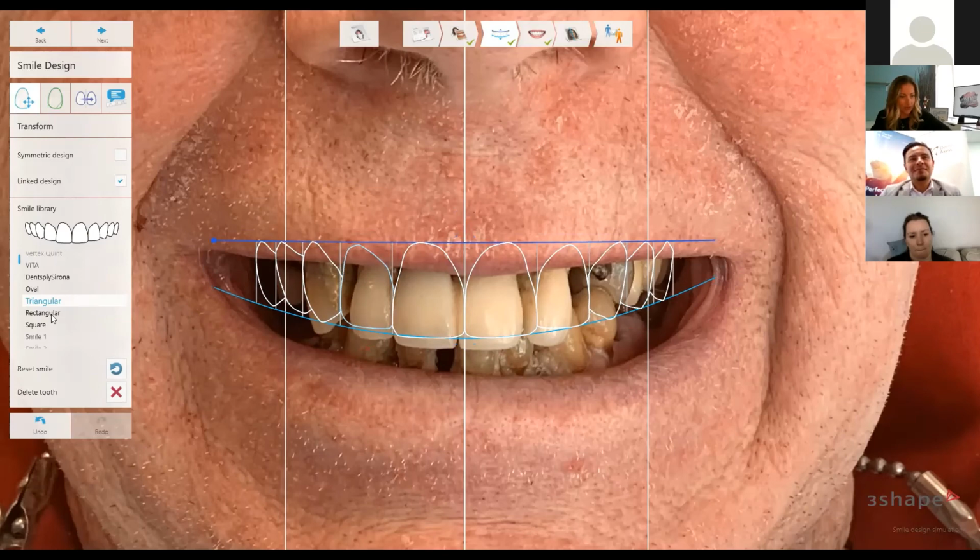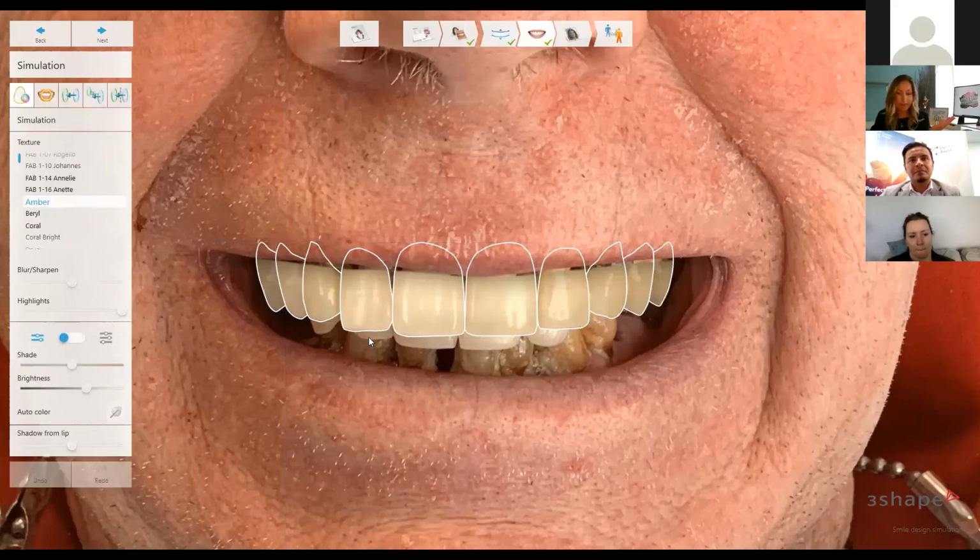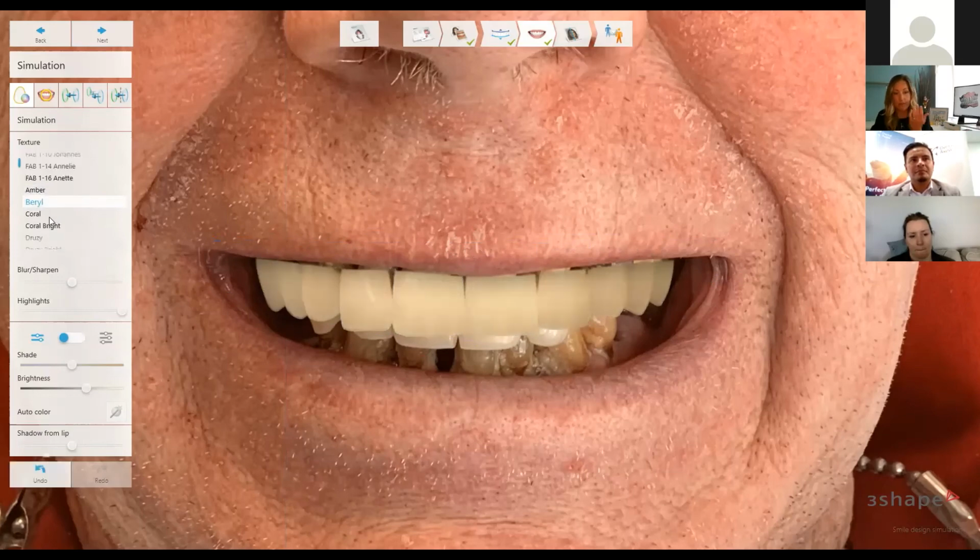So just going to fast forward. We've gone over this. If there's something you don't like, you can just click on here and it'll remove the whole smile design. For example, that partial case that I showed you, how useful this would be for partial planning. You can fill in the gaps, and then of course you can undo that. So here it is. It's just giving you a quick rundown of what you've plunked in, and from here you can go in and adjust the shading.